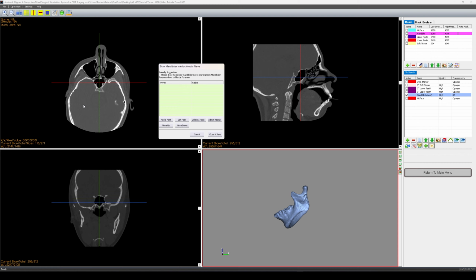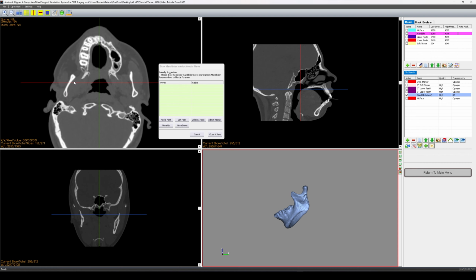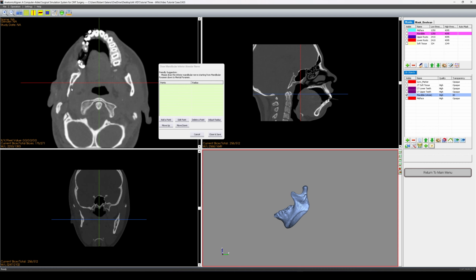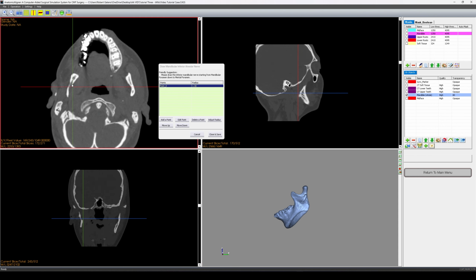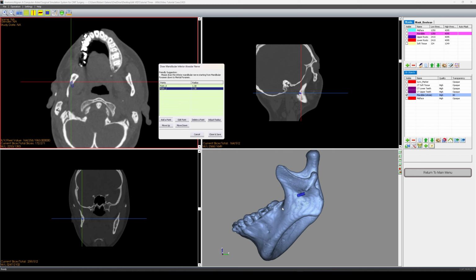We need to scroll to locate the mandibular foramen. Let's do that. Let's also zoom in just so we can make more accurate selections here and see more clearly. So let's find that. It's about right here, and we'll start with a point. We'll place our points down, and we'll see that these aren't really points but rather enclosed geometries with a radius. This radius is the nerve thickness, and it's default at 1.3, so let's leave it at that.